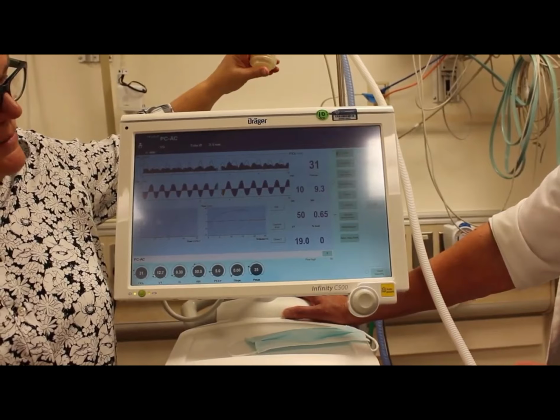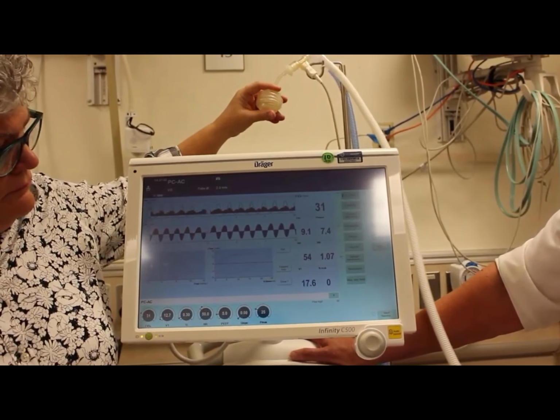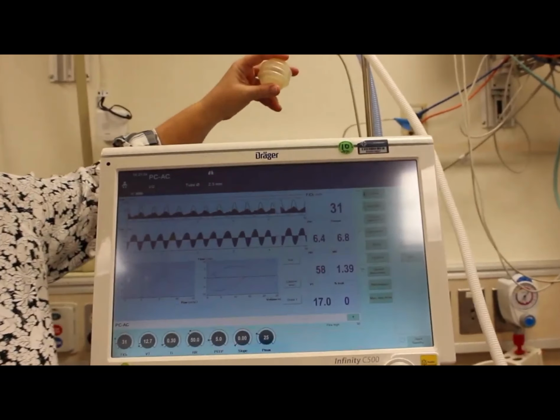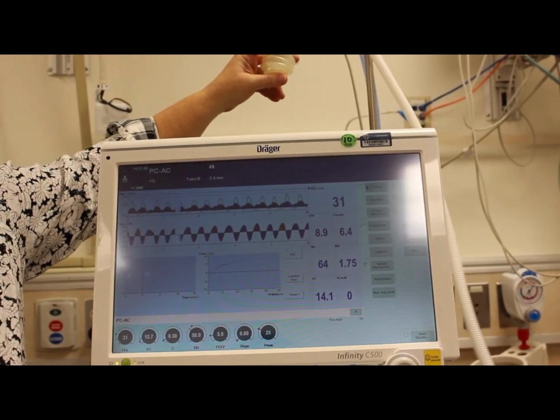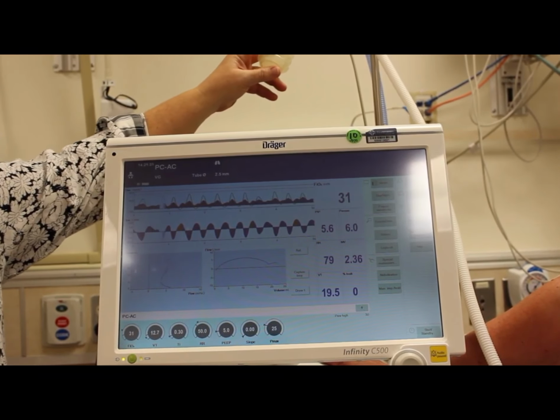What happened? Why is that? What is one of the causes of that? The biggest cause is water in the circuit, and you will see the inspiratory circuit dancing around with water in it. Or the trigger may be too sensitive.